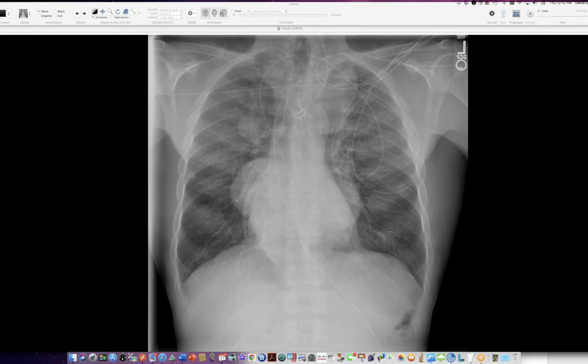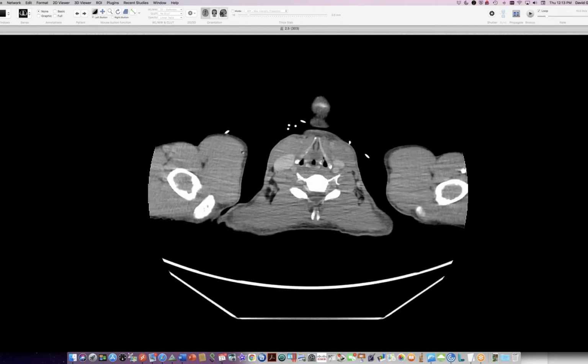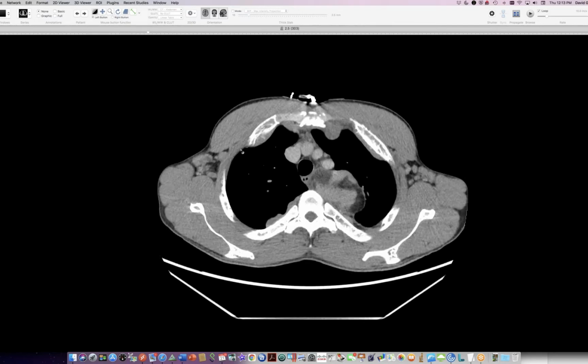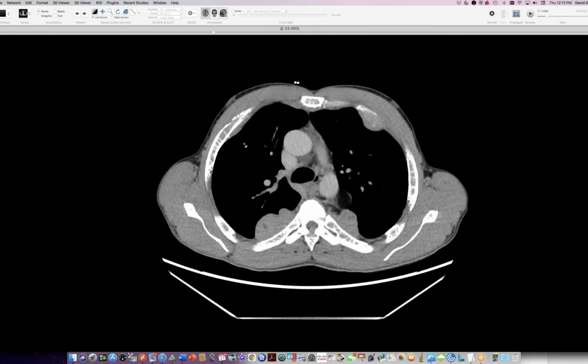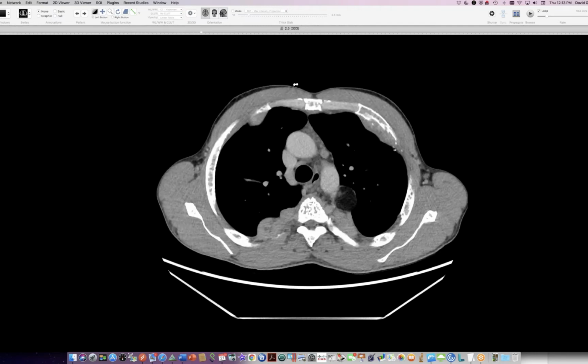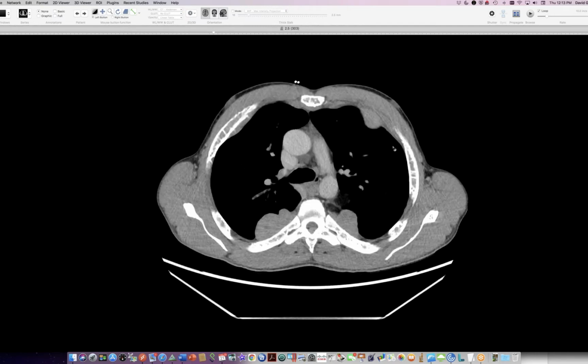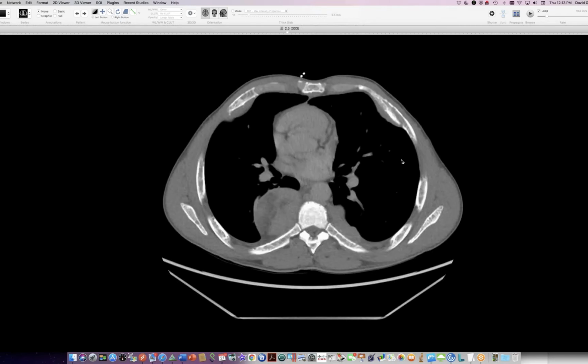So this alarmed the resident appropriately, and there was a lateral view that shows one of these big masses posteriorly here, and you can see there are anterior masses too. There are really masses everywhere. So this prompted a CT scan, which is also abnormal. We have these big masses, many of which are paraspinal, others of which are adjacent to expanded ribs with cortical erosions, sort of porous looking bones everywhere. All the bones are abnormal here, expanded marrow spaces and so forth.